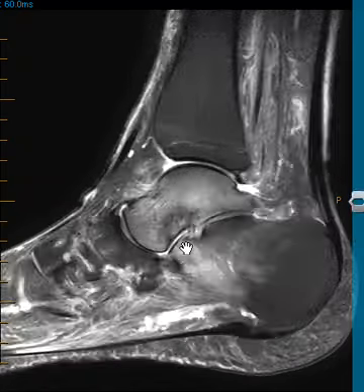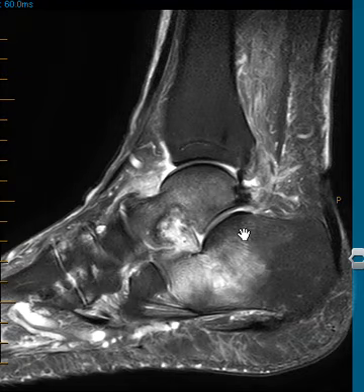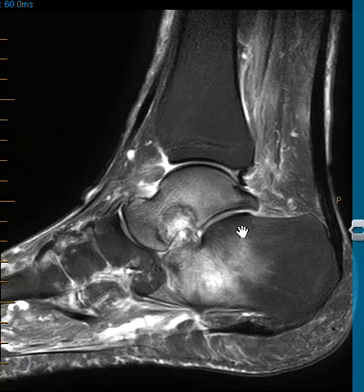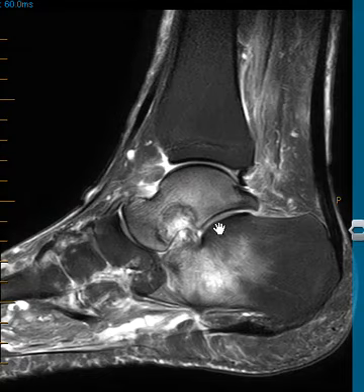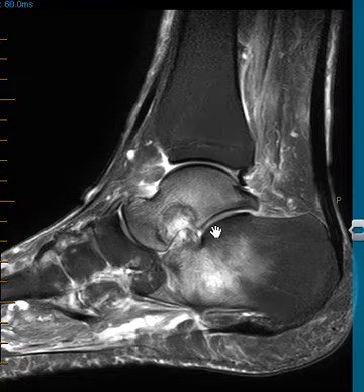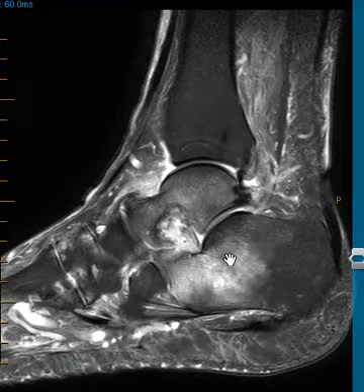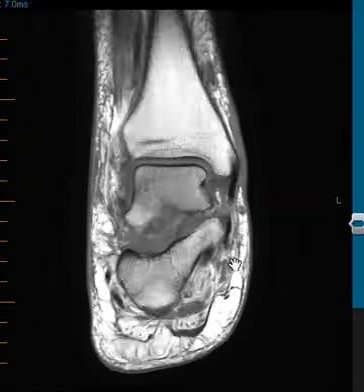And this is really classic for gouty arthritis. And in the sinus tarsi you can get gout, especially in an older male like this. That is by far the most likely thing it could be. But rheumatoid arthritis, ankylosing spondylitis could also do that. You can have infection. They could look like this. But just the scalloping, prominent erosion, and this foggy marrow edema, all are really classic for gouty arthritis of the sinus tarsi. Just one more look at this here.